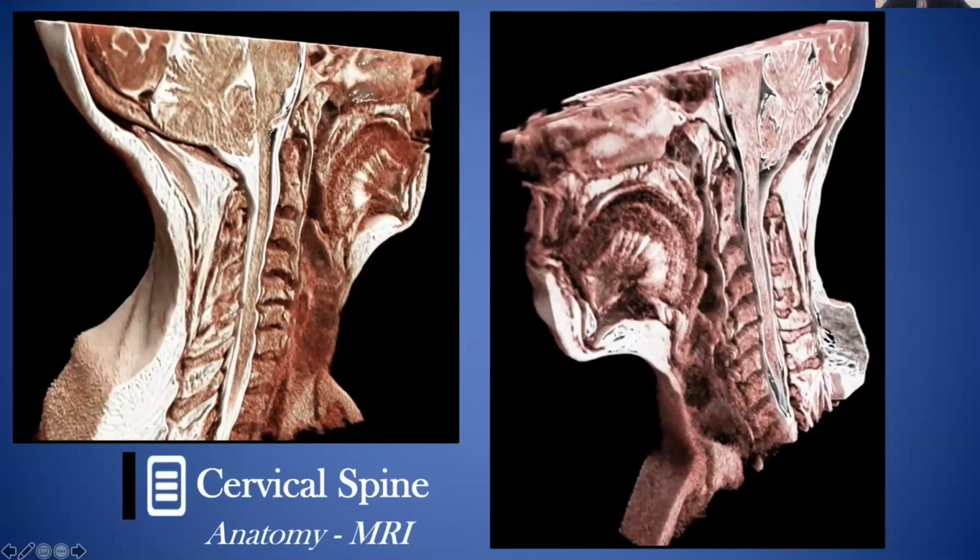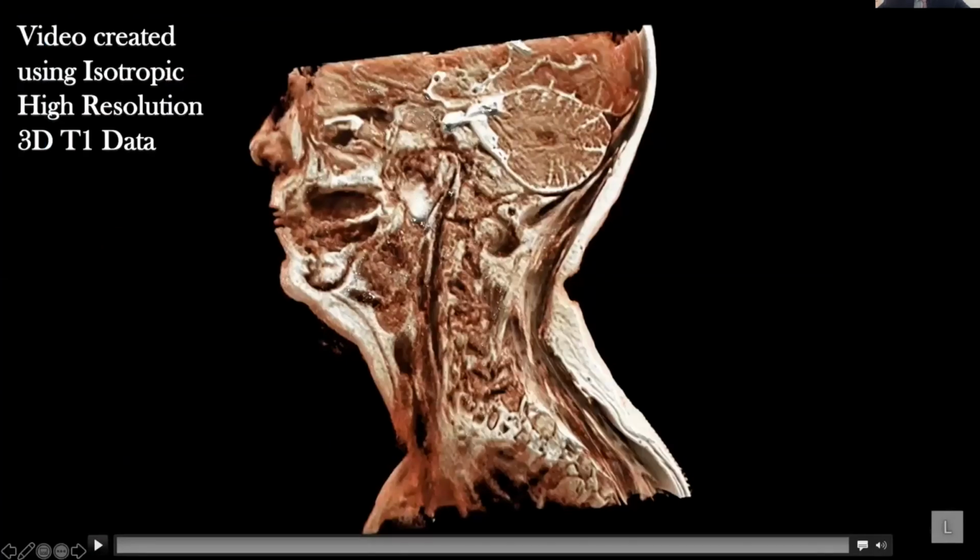So just quickly, again, cinematic rendering; we can do this with MRI as well. This gives it a very almost cadaveric quality, I feel.